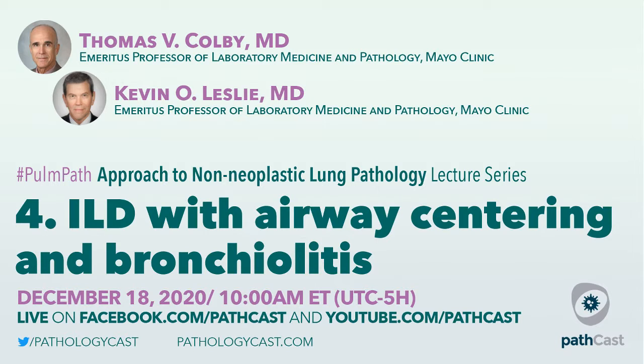Thank you. The next question is, is it possible to diagnose bronchiolitis on transbronchial lung biopsy or cryobiopsy? The answer is yes and yes. Obviously, with a cryobiopsy, you get a bigger specimen and you can get whole airways, and you can see all the abnormalities that I've shown you today, all of which came from surgical biopsies, of course. With a transbronchial biopsy, it's smaller, so there are going to be fewer airways, so the sampling is less.